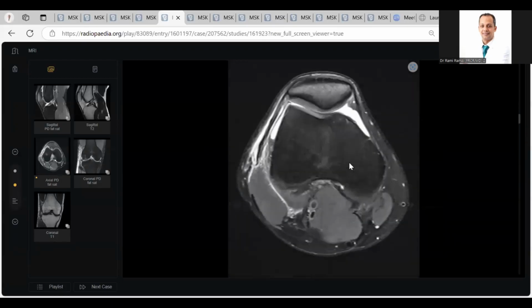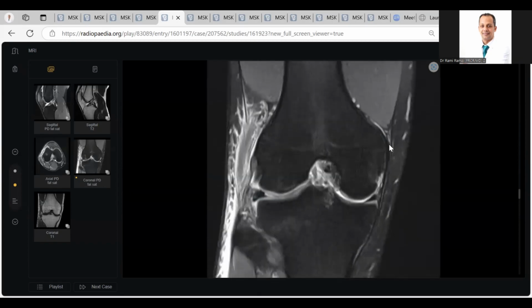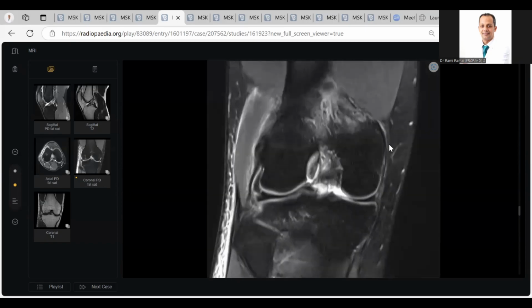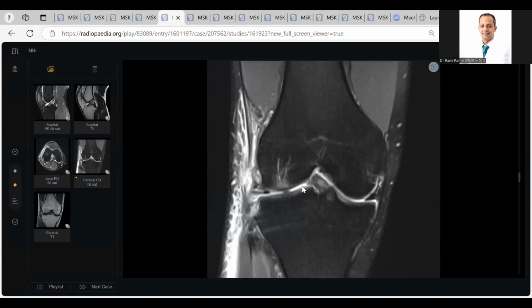I think here in the lateral retinacular ligament, there is some sprain. Also here, and this is the site. You should start with the lateral side injury. You wanted to skip it, and I told you, no, tell me about this. There is a complete rupture of the ligamentous complex here, completely.